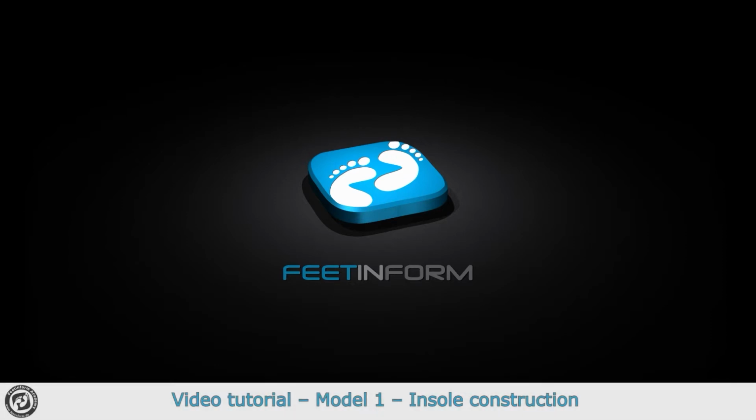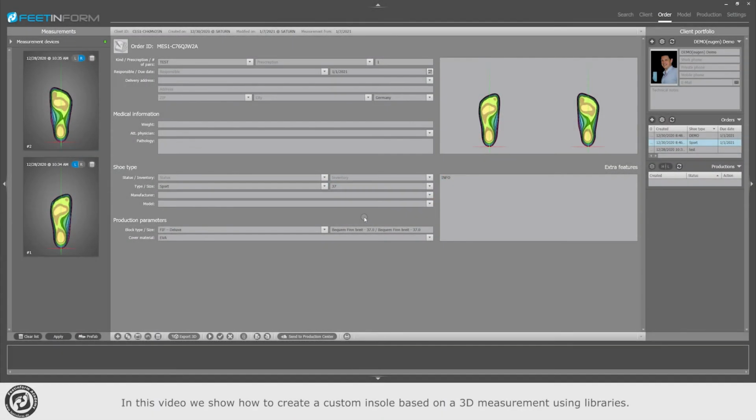Model 1. Insole construction. In this video we show how to create a custom insole based on a 3D measurement using libraries. Here we see a freshly created order with 3D measurements of a customer. We switch to the Model tab.